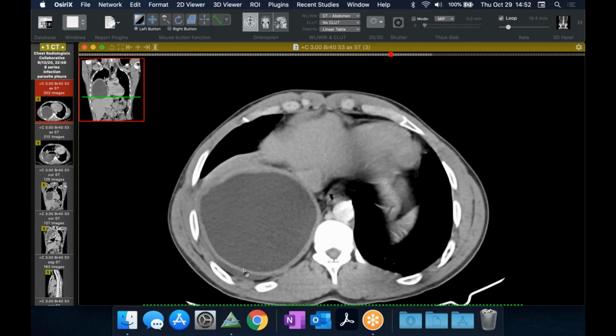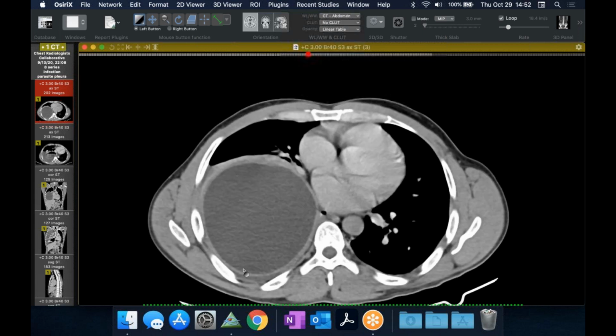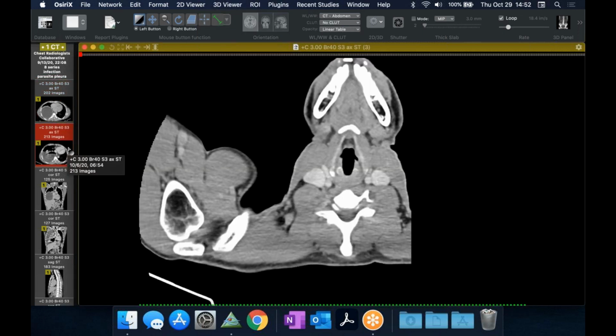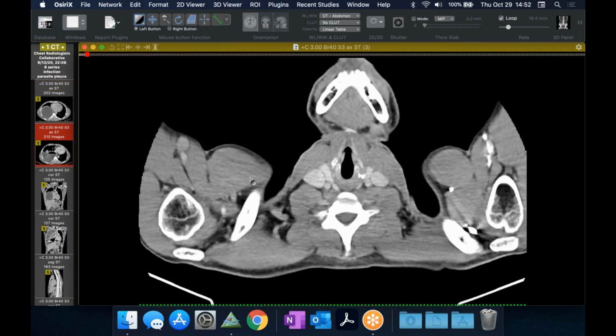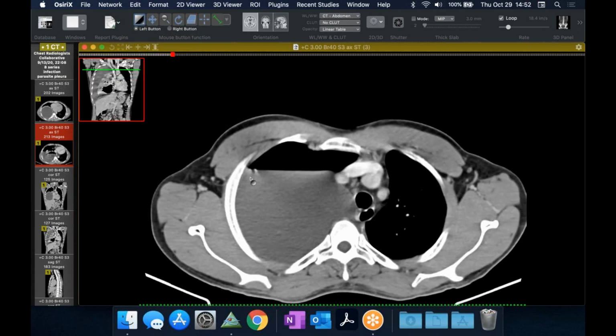This is just kind of a classic case, but a really nice example. And I don't have a formal diagnosis yet. So these are about 3 years apart. And this is a woman in her 70s who had some shortness of breath. And I'm not sure why it never got worked up. I did not dig around so much, but she had shortness of breath and underwent a CT scan back then.